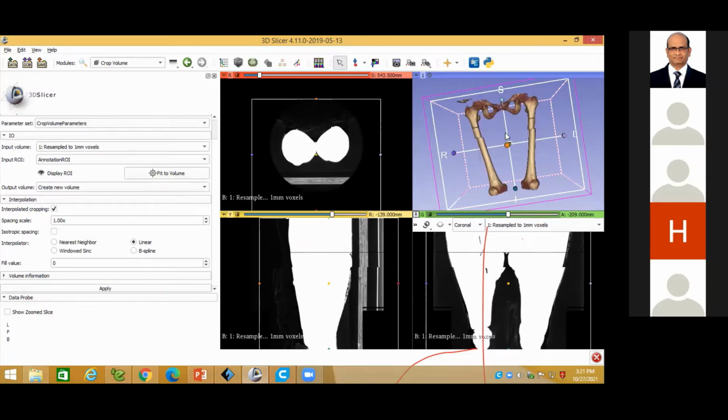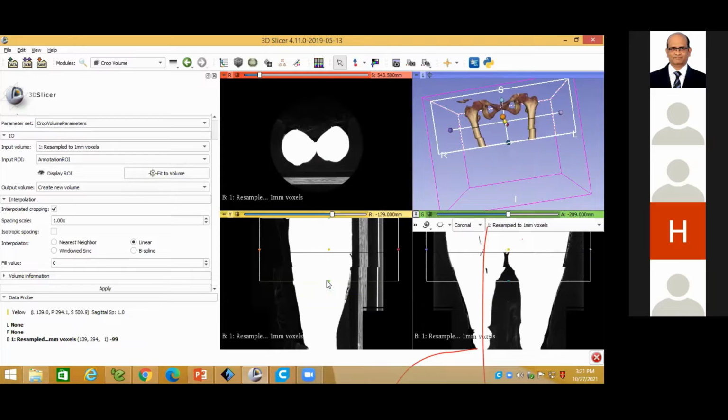Okay, now you can see how it is there. I don't require this here either, so I want to change it. I'm pressing here, then extracting here. I don't require this image, and this image I don't require either. But something is also being cut here, so you have to check the 3-dimensional image.